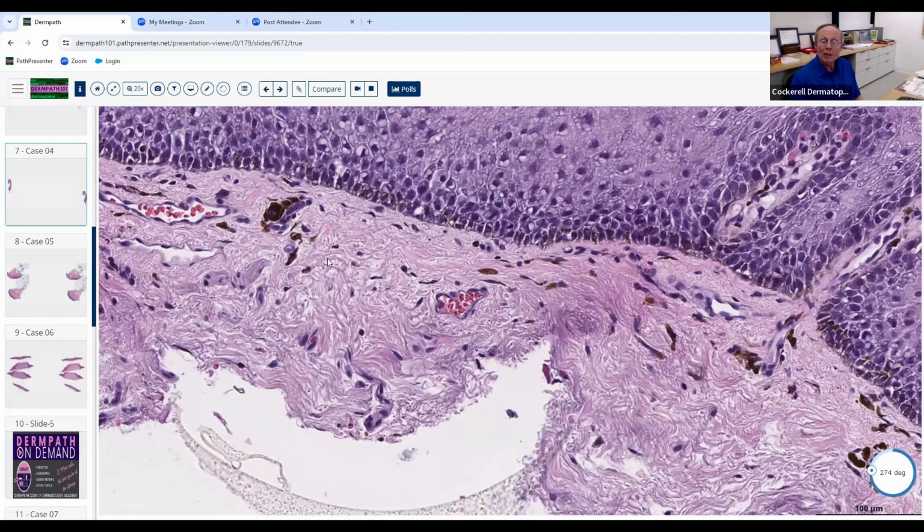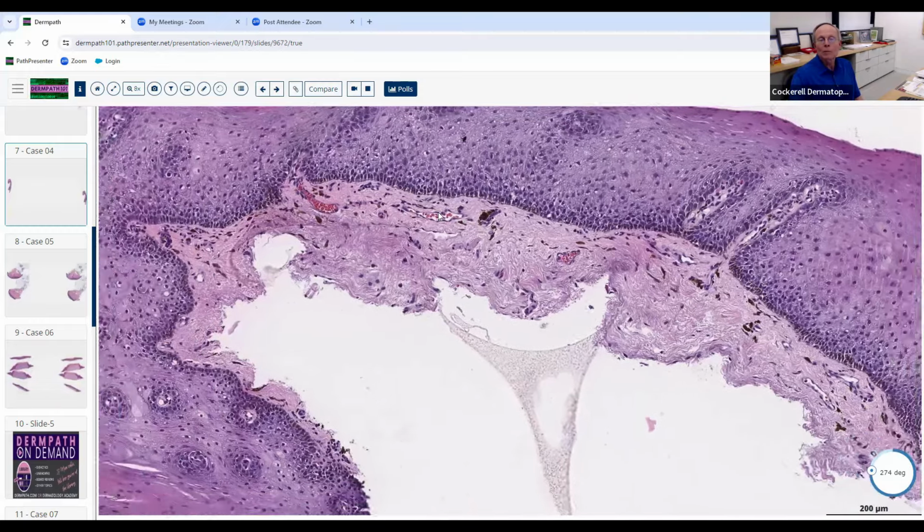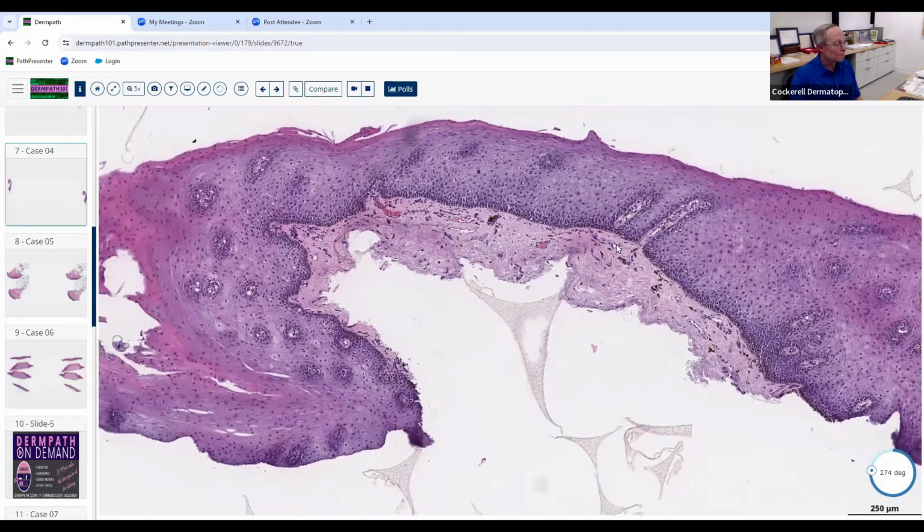It's also not hemosiderin. It's not iron. Iron is golden brown. It's refractile. If you were to take the microscope and rack the condenser down, you'd actually be able to see that this melanin was not refractile. It's not a crystal, so the light doesn't get refracted through it in the same way. So those are some things that are on the differential diagnosis. They probably wouldn't put anything that could theoretically look like this, like some sort of drug-related hyperpigmentation, but they might put something like an exogenous pigment on there to expect you to be able to tell that from melanin here.